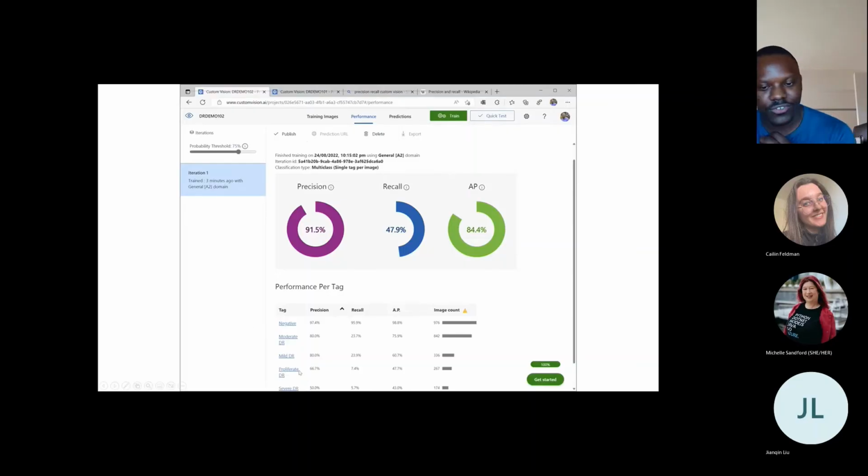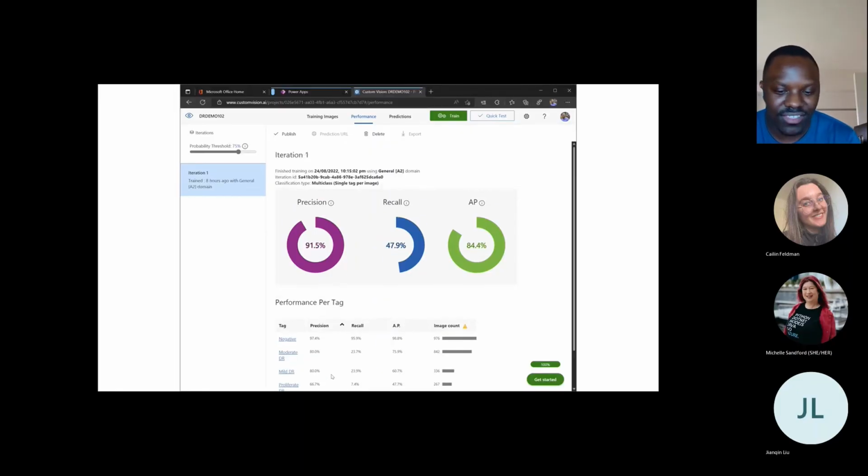So that was just a demonstration on the two models. I think it works out well because we can actually compare one with little data to one with a larger data set. And earlier on, the demo one with the smaller data set worked fine. But in this case, we can see the one with the large data set works fine as well, better actually than the other one.